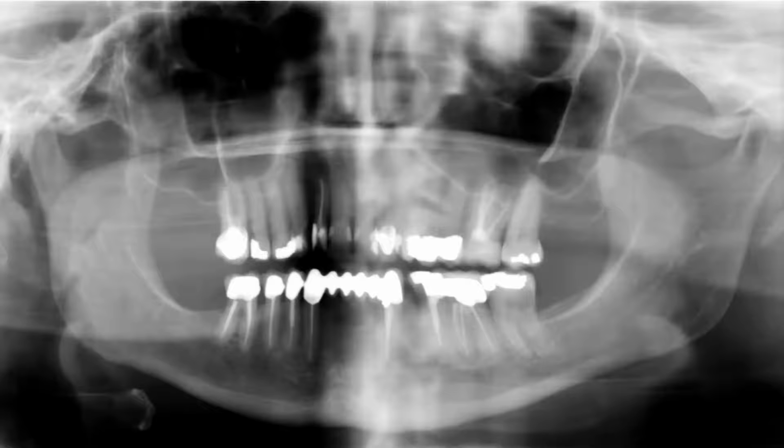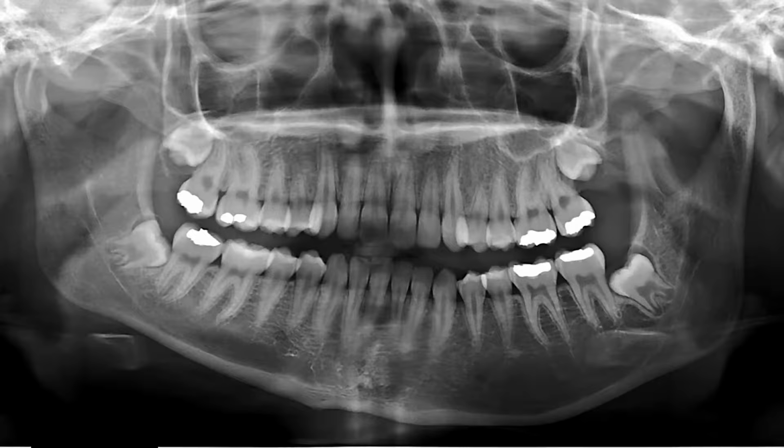The opposite error in this patient. This time, the left posterior teeth are wider. These teeth are wider. They are away from the sensor compared to this. So this is closer and this is away. So it's more magnified. Again, the left ramus is wider than the right ramus. So that's lateral error. The patient's head is rotated to either the right side or the left side.